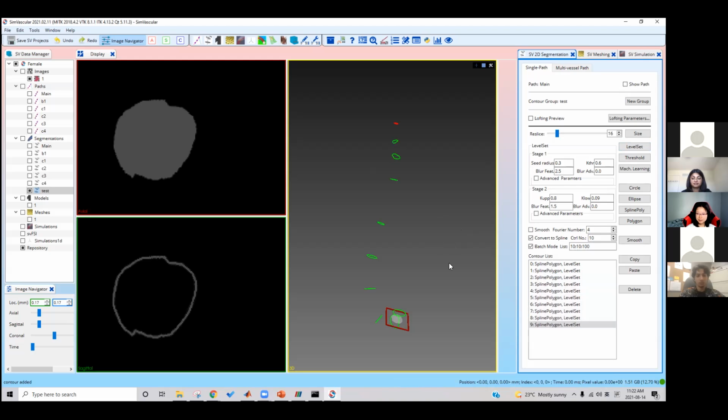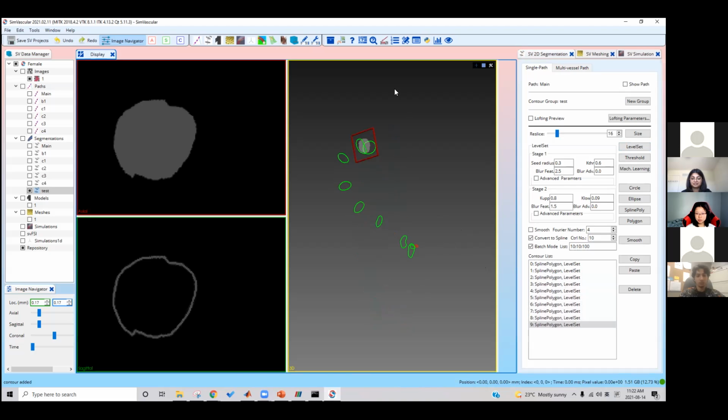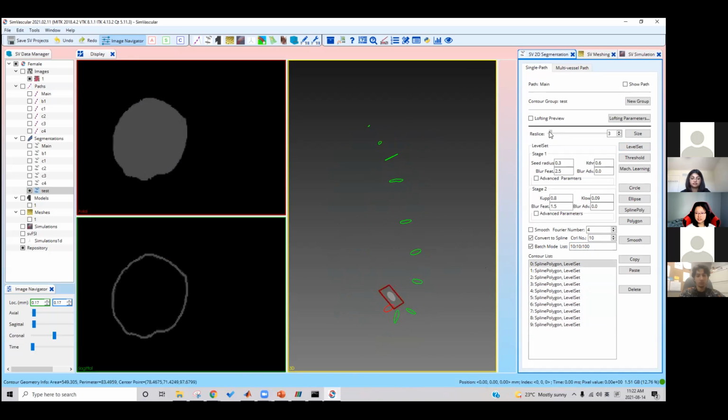Magic. Okay, so this looks pretty good to me, but obviously I'm going to have to go through these to make sure that the slices are in the right places. So I'm going to start with this, because this part is all missed. I don't want to miss all these segments, so I'm going to reslice everything. Make sure when you're reslicing, just uncheck the batch.